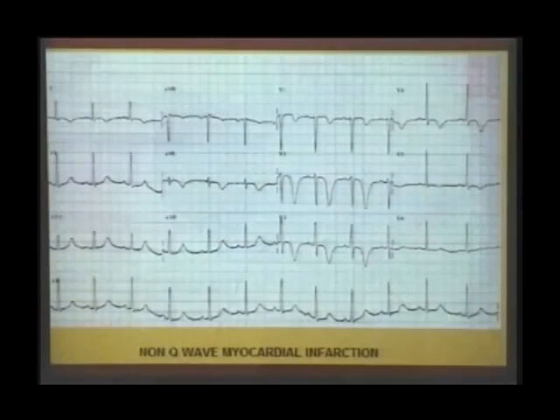Because the patient did not have any complication during the acute phase, you are likely to discharge. But the important clue here is, many times the patients who come to you with this type of change, a symmetrical deep T wave inversion in V2 to V3, non-ST elevation, troponin positive, if you discharge these patients, they will come back within 2 to 3 weeks with a massive ST elevation MI.